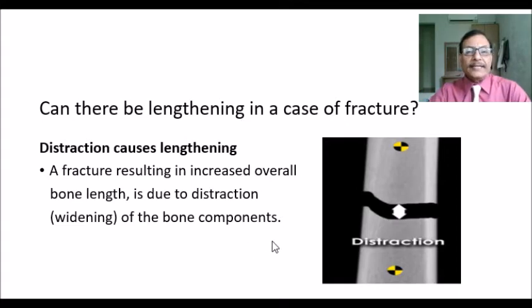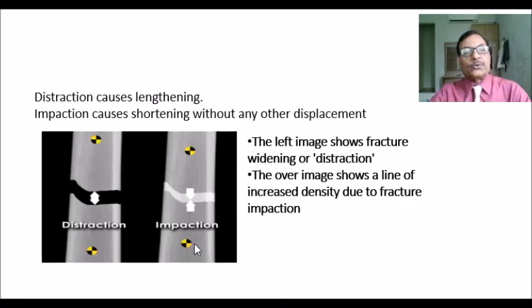Can there be a lengthening in the case of a fracture? Yes. If there is a distraction between the two fragments, it will cause increased length, and that is called lengthening. So distraction will cause lengthening and impaction can cause shortening.